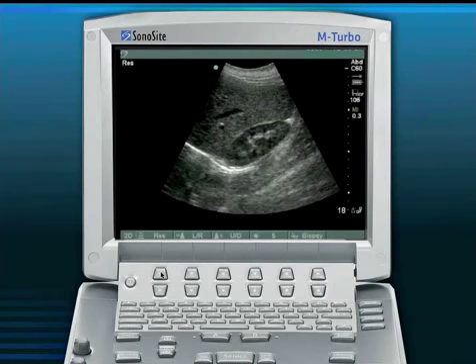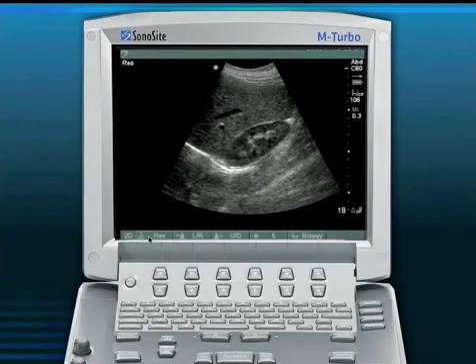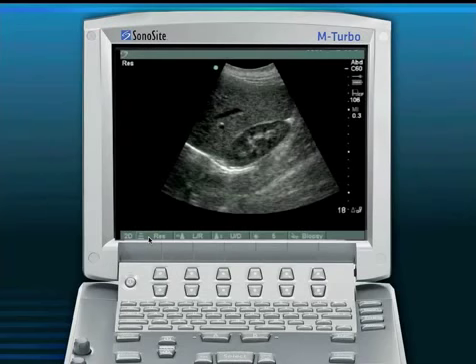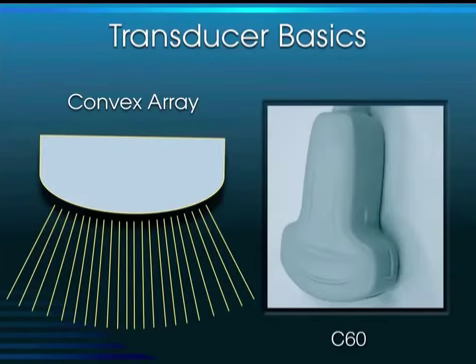And if I push this button again, I'm going to go to the penetration mode, which is the lower frequency setting. So in this case it would be the 1 megahertz setting, and the dots got a little bit more spread out from one another. So if I go back again, here's resolution, here's general. I'm going to now take the frequency up to the resolution mode and then down to the penetration mode. So gen, pen, res, the three frequencies about which each transducer can toggle.